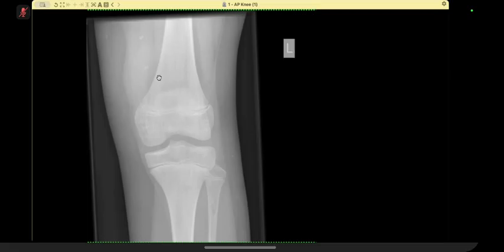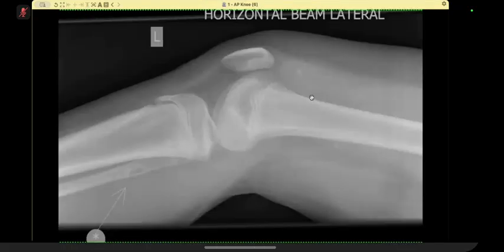So please remember, in radiology, there is a black and white world and there is a gray world. So a safe radiologist knows the difference. Having said that, when there is a black and white world, when you can make a diagnosis, your confidence is what they are looking for. So in this case, these are phleboliths. Look at the age, look at this soft tissue swelling, which you had picked up. And of course, these phleboliths you had picked up.